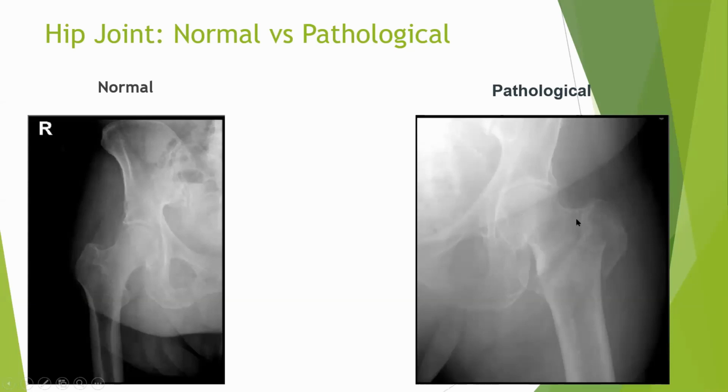Again, with this x-ray, I am not sure. I probably need an MR scan to really hone in to understand if there is any intertrochanteric fracture present or not. Other than that, that's basically what I can see. And obviously you can notice a little bit of sclerosis, cortical thinning right across here, cortical thinning right around the neck of femur line. All right.